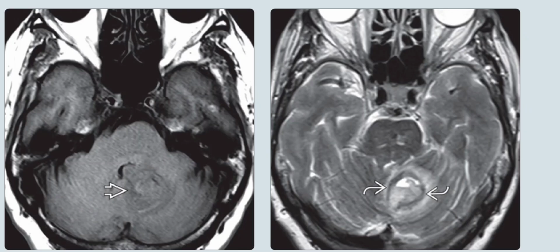Left image is the axial T1 weighted MRI in the same patient, and it shows the cerebellar hemorrhage is predominantly isointense and mildly hyperintense to the surrounding brain parenchyma, indicating hyperacute blood products.